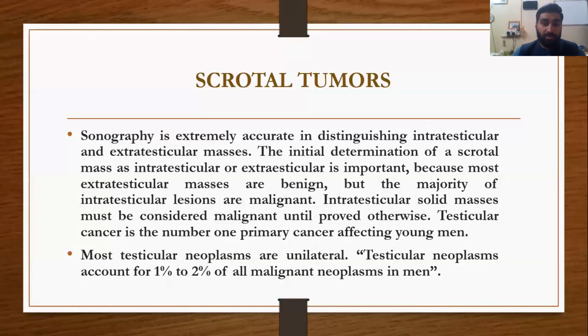With scrotal tumors, sonography is extremely accurate in distinguishing intratesticular and extratesticular masses. The initial determination of whether a scrotal mass is intratesticular or extratesticular is important because most extratesticular lesions are benign, but the majority of intratesticular lesions are malignant.